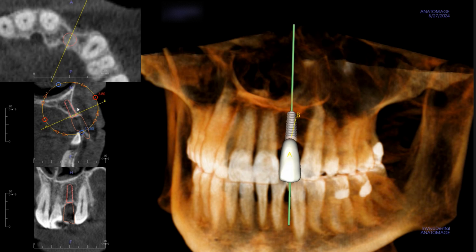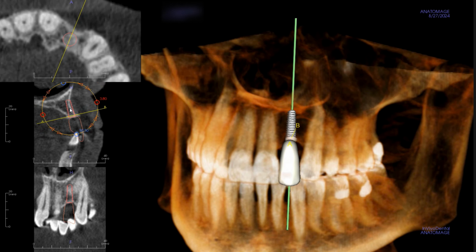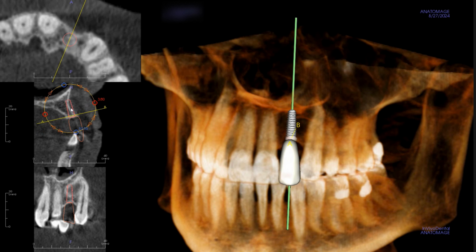So if we were looking for a more ideal situation, I do think this implant would be better served at this angle, with the platform head being right there. Let's actually do that. And we're doing all of this planning not knowing the soft tissue profile of the situation. I'm just going to make the assumption that this patient has a moderate to thicker phenotype or gingival biotype. If not, then a whole other conversation should be had. But in general, I think this is a pretty good position of where the implant should go.